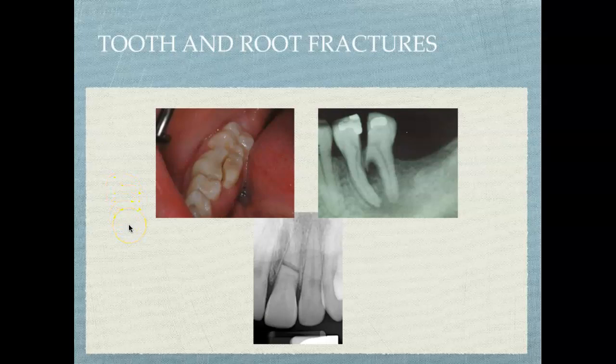Some other dental conditions, it would be a fractured tooth, and then how that could be interpreted on a radiograph. You can see the fracture very clearly. Ouch, that's a pretty serious one, through the furcation, through the root. And here is another root fracture. I'm going to reiterate the importance of interpreting radiographs. If you were using traditional film, in this particular radiograph, you might think that you have a bent film error here.